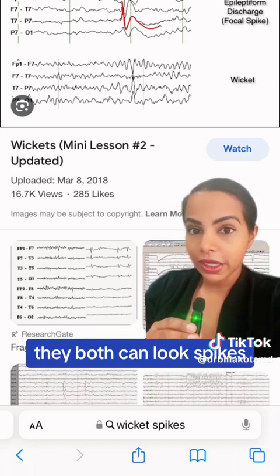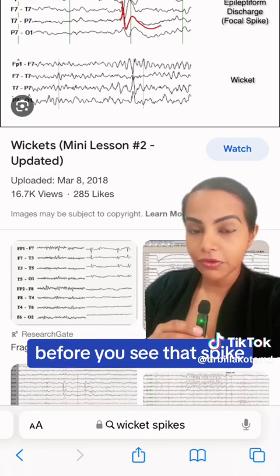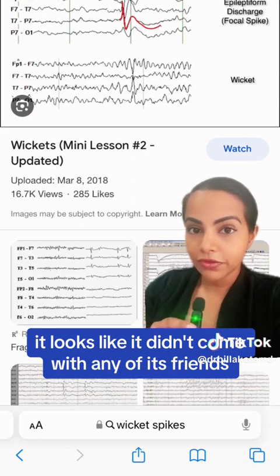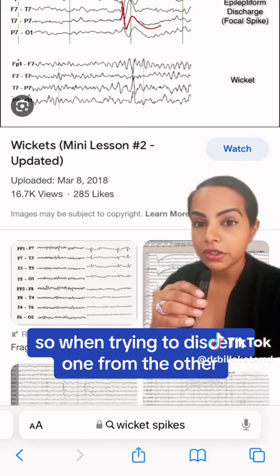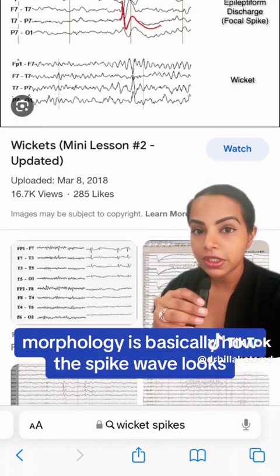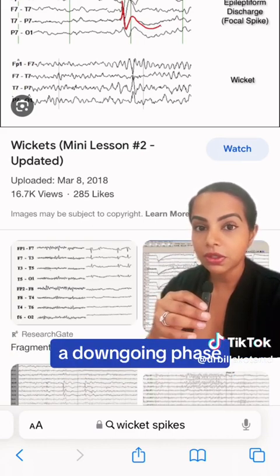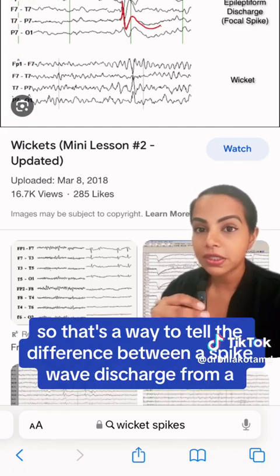As you can see, they both can look spiky, but the one below occurs in runs, which means there's multiple of it before you see that spike. Whereas the one up top, it looks like it didn't come with any of its friends. So it's by itself. It is an epileptiform discharge. When trying to discern one from the other, we're looking for if it breaks the background, if it comes in runs, and also morphology. Morphology is basically how the spike wave looks. We talked about the one above having an upgoing phase, a downgoing phase, and a slow wave behind it. The one at the bottom does not. So that's a way to tell the difference between a spike wave discharge and a wicket.